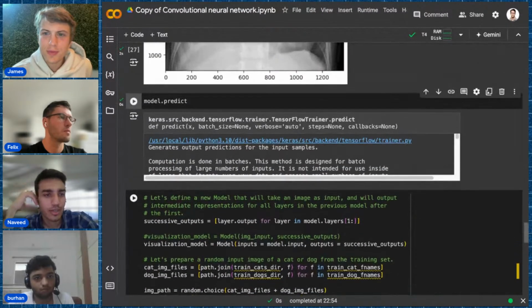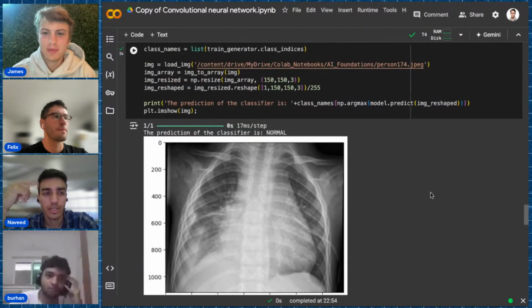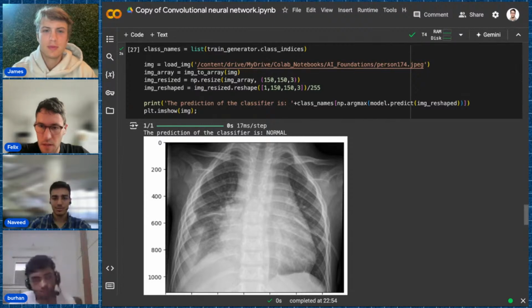Felix, do you also have examples from the normal class? Try that one. All right. Give me a second.